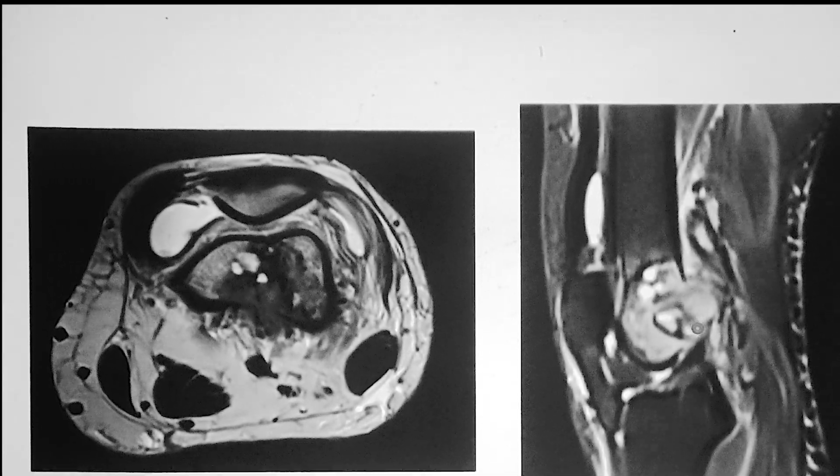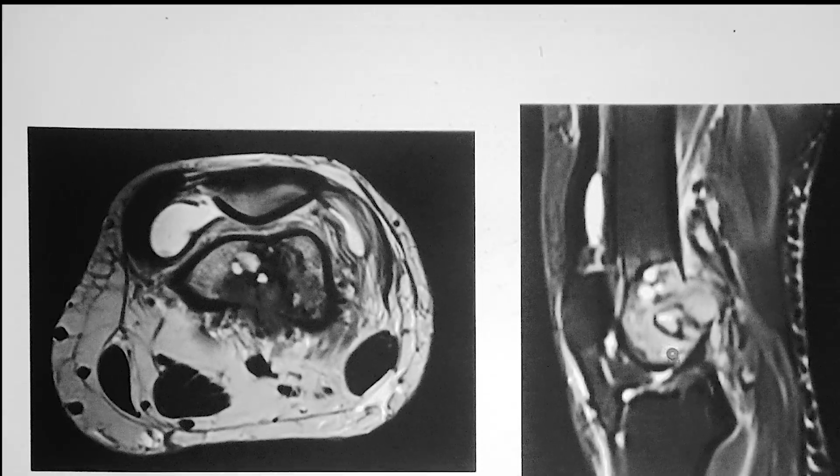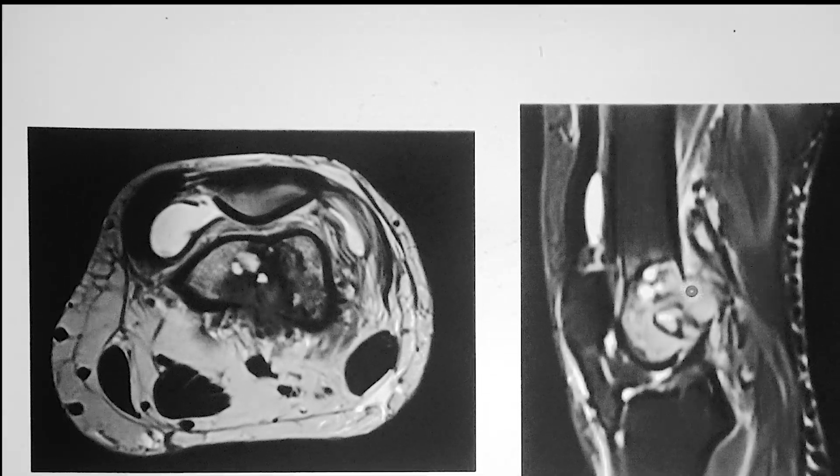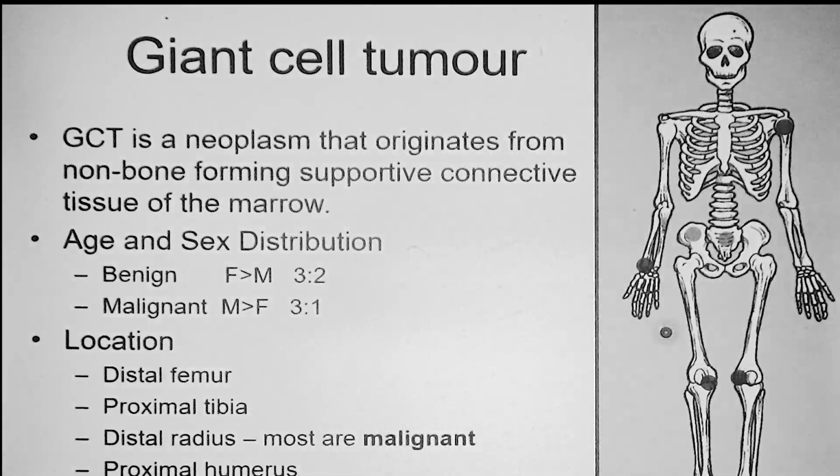So when you are reporting an MRI, the importance is to note how close it is to the joint line, how far it is extending, and whether there is a breach. So GCT would be correct in this case.